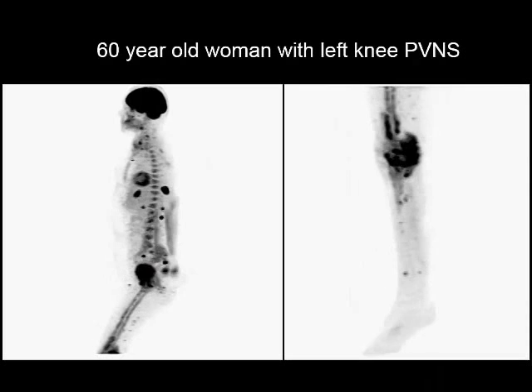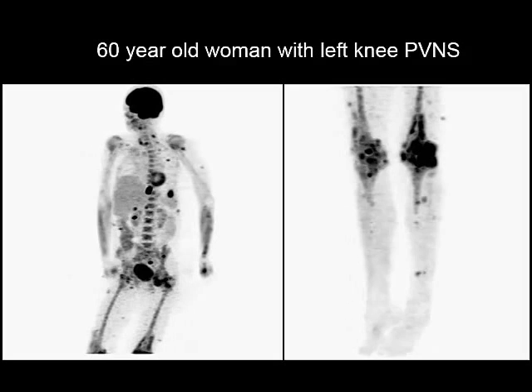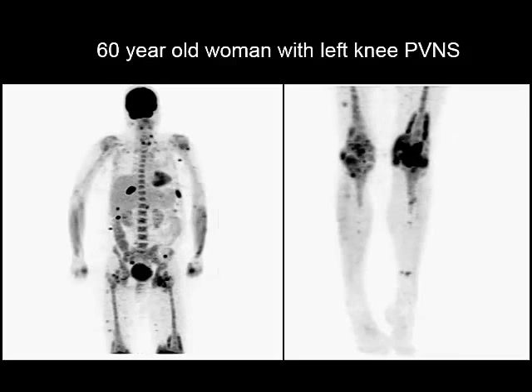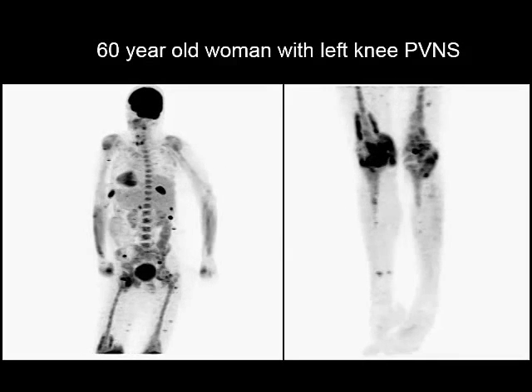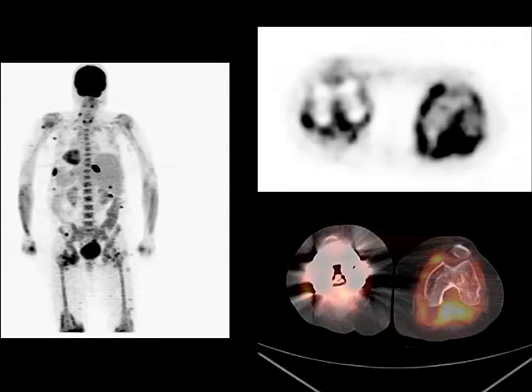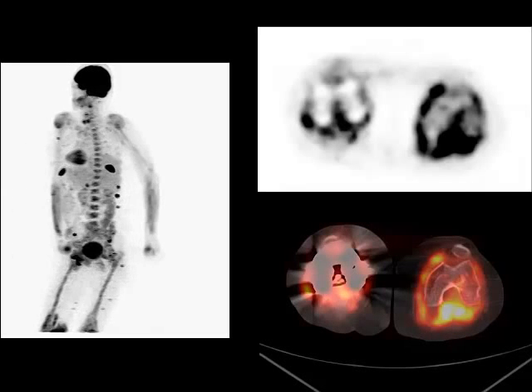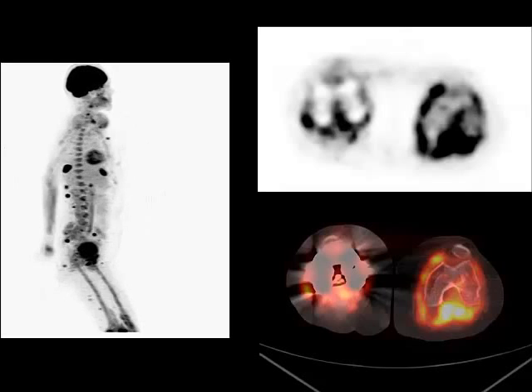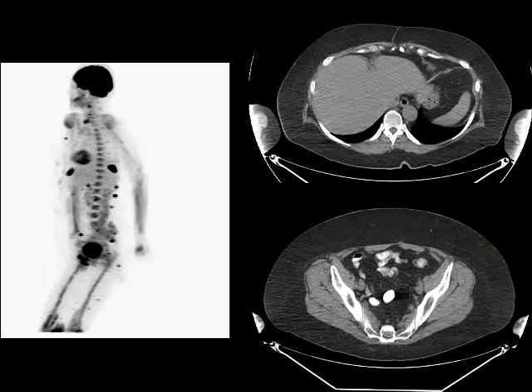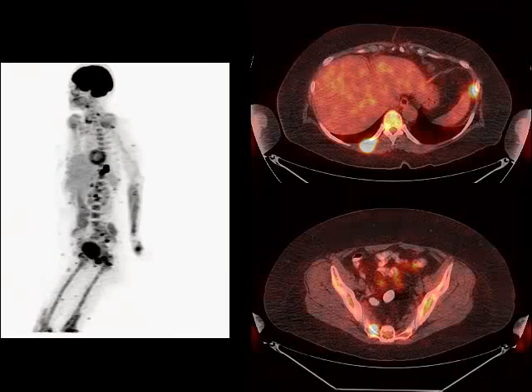And I promised my colleague Dr. Fry I would show this case of a 60-year-old woman who had a long history of PVNS of the left knee, had had multiple prior synovectomies and therapies, and we can see this PET CT scan. She started presenting with areas of musculoskeletal pain. We can see the recurrent disease throughout the left knee joint. She's had a prior right knee replacement, and a lot of that activity on the right-hand side is probably just reactive or adjacent to the metal. But we can see recurrent synovial hypermetabolism in the left knee, and then these interesting areas of activity elsewhere in the body, including in the posterior chest wall, in the posterior pelvis.